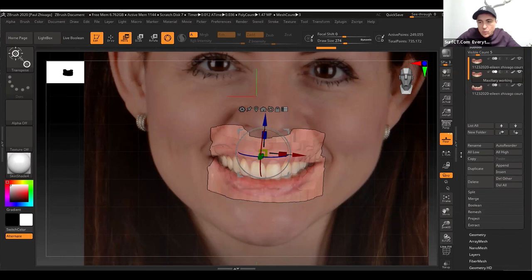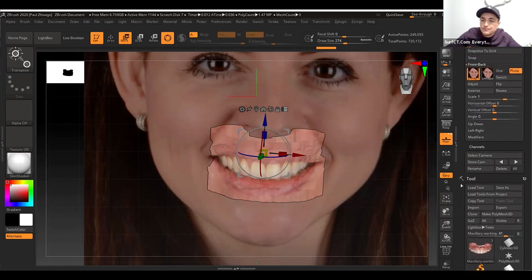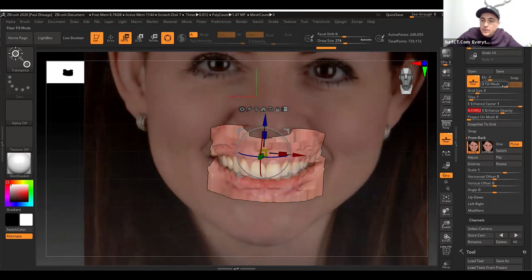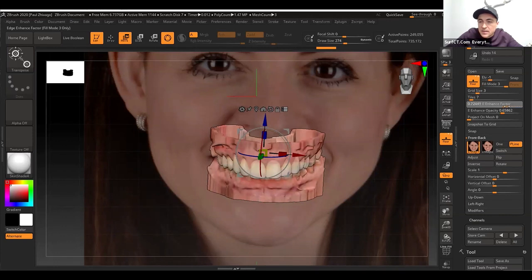So one more thing I want to show you, and for that reason, let's just go back and create a little bit more of an opaque view. Maybe we go to fill mode 2. So here we have a full, or maybe not fill mode 2, maybe let's keep it in fill mode 3, but let's move the enhance factor less.